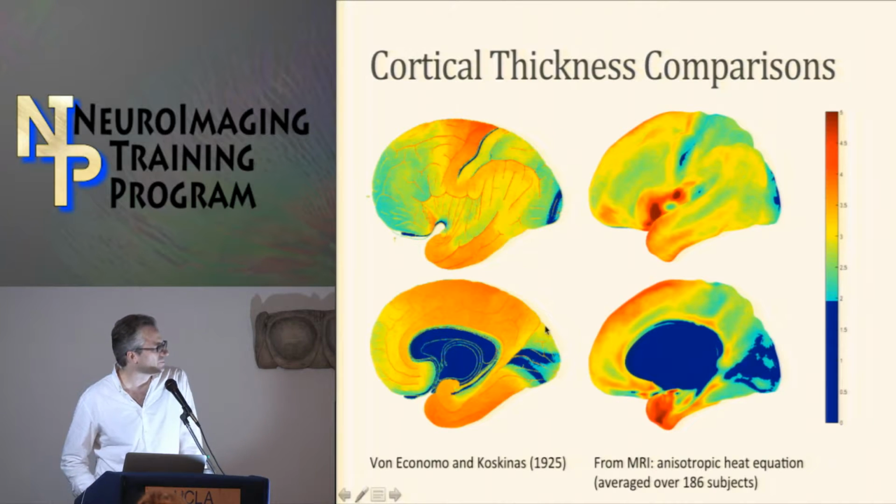So if you are using our software for cortical thickness measures and comparisons, I would really recommend running this process. It takes a while to run, but it's worth it for doing these types of studies.